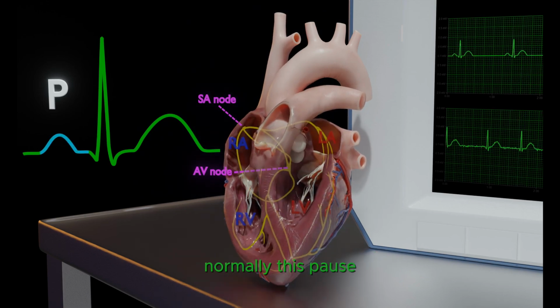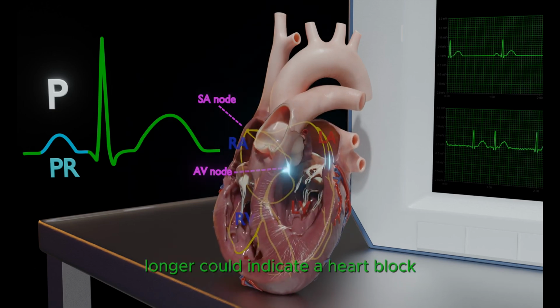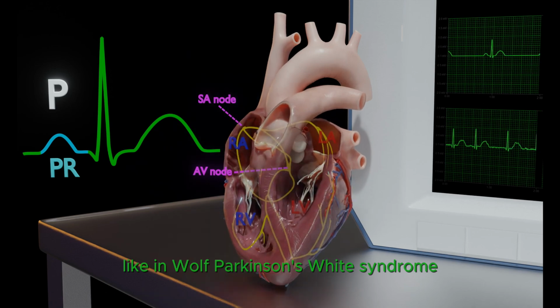Normally, this pause, the PR interval, should be between 0.12 and 0.20 seconds. Longer could indicate a heart block. Shorter could mean the impulse found a shortcut, like in Wolff-Parkinson-White syndrome.